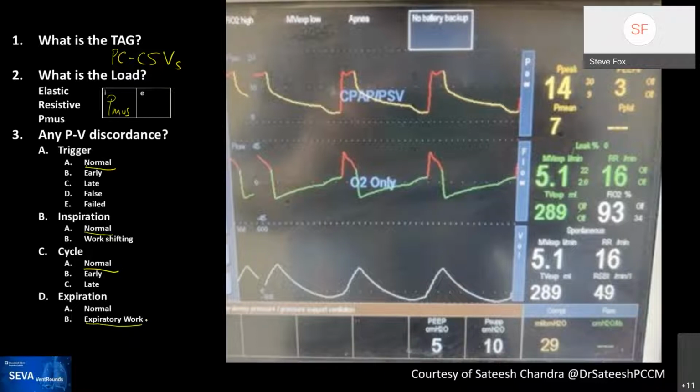So I'm trying to see what the interesting thing about this is. I'm sure there must be some trick in here somewhere. There's something funny here about the way the expiration goes. It's a very short inspiratory time and a very long expiratory time with a slow expiration. I don't know if that is of any significance, if it's a patient who has some obstructive disease and is subsequently compensating with a low rate. I'm trying to see if there's anything else funny going on here that I should pick up, but I can't think of it. Probably a trick in here somewhere.